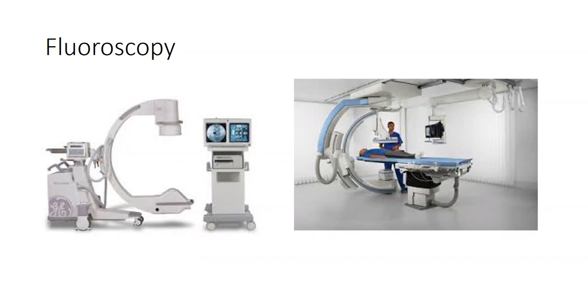This setup costs $250,000 to $350,000. The hospital has maybe 6 of these. Okay. They have some mini ones for things like hand. But what you can do with this is that there is an X-ray source down here. There is an X-ray detector up there, and you immediately get the information on the screen. Okay. And this is an example of an interventional radiology suite where you can do procedures like injections, or if that's a cardiac lab, you can pass a catheter in and then inject a contrast agent like the iodine we talked about before that your kidneys will clear quickly later, and you can actually light up the tree of the coronary arteries. That's what cardiac catheterization is all about. And they use fluoroscopy for that.